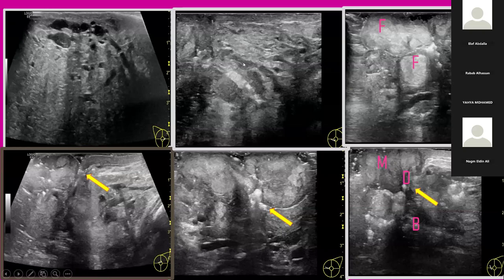So that attracted my attention, the ductal convergence toward that lesion and the underlying, and even within the lesion itself, what I could appreciate is only fat lobules. I was thinking that it was bulging breast tissue getting outside the breast. I traced it and I could see the defect here with the adjacent skin swollen. Swollen adjacent skin.